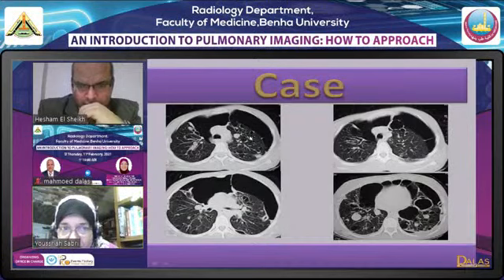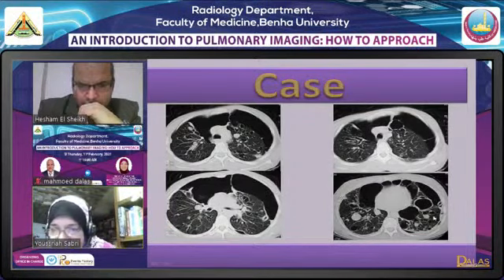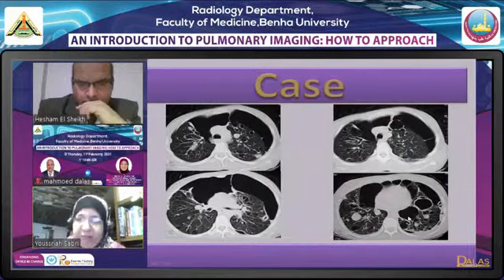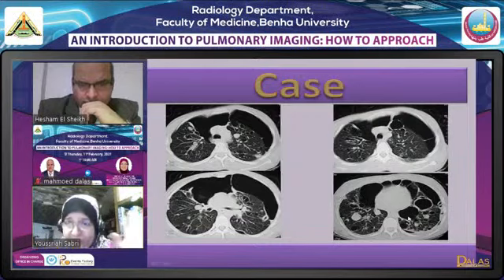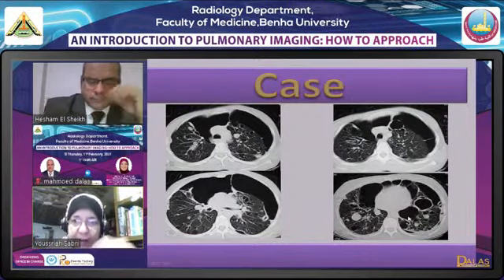cysts. والسيست دي ما فيش سايت اوف بريديلكشن، بيأفكت من فوق لتحت. اوكي؟ في upper lobe وميدل ولور وكل حاجه. cysts all through a wall is so clear as you can see here. تمام؟ فده منظر مختلف تماما. الانفيزيما السنترال لوبير بتبقى خروم وابر لوبر بريدومينانس، وغالبا بيبقى في other signs of COPD، هايبر انفليشن وهايبر لوسنسي وبرونكيال وول ثيكنينج اتسترا. هنا مفيش سايت اوف بريديلكشن الناحيتين.